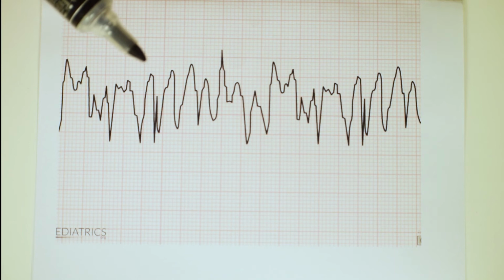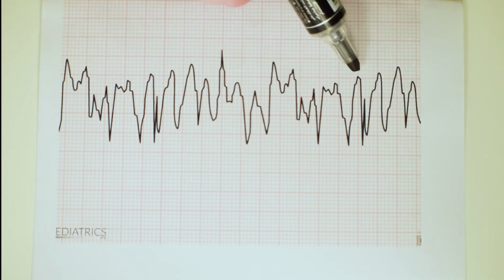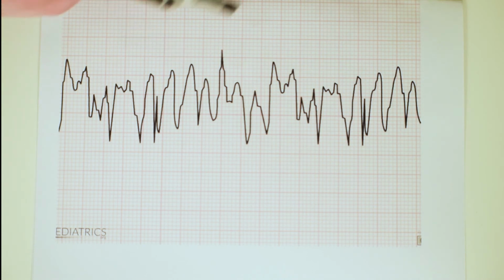So this is what a ventricular fibrillation looks like. You can see how it's broad and how there's no pattern. There's no rhythm, it's not regular in any way. It's changing in sizes all the time. So the way you treat this is you defibrillate. So we have a ventricular fibrillation. Treatment is defibrillation. That's pretty much all I can say about this.